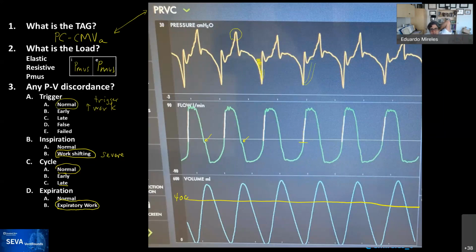So it's pressurizing rapidly, pressurizes all the way to the top, and then because it's in adaptive, it's just giving very little support. And if you imagine that it pressurized, it overshoots, and then probably this is the baseline. So all of this area over here is the patient working on their own. It's all effort in. The patient is inhaling actively. So I think the trigger, you just cannot do it better, is normal. There's just a lot of trigger work. The machine is triggering as fast as it can, but this patient is doing all the effort in the universe.